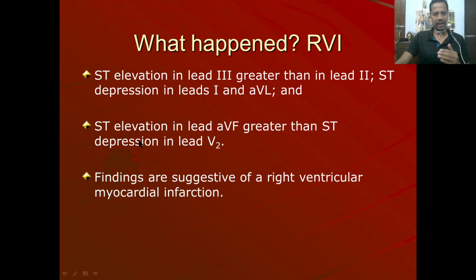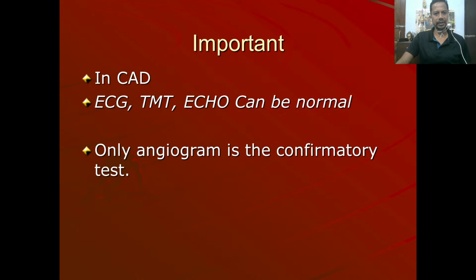And you will see ST elevation in lead AVF which is greater than ST depression in lead V2. You have to just memorize it, and that circle I will explain how these changes are happening. Then findings which are suggestive of right ventricular infarction, these are the findings, okay.